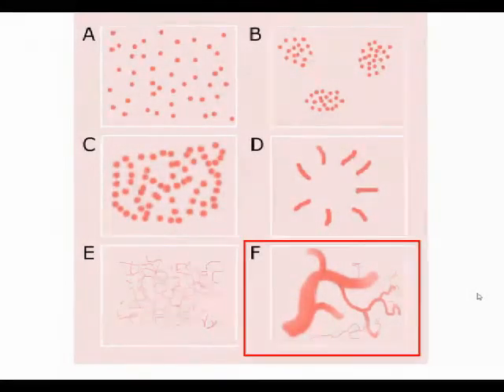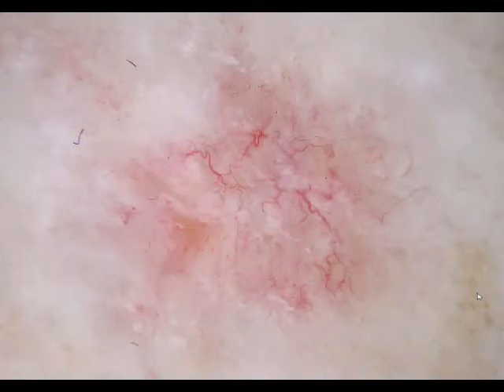This arrangement is very common. It occurs with serpentine vessels, and we call it branched arrangement, which means that from a thick serpentine vessel there are many thinner serpentine vessels branching off. This is an example. Clinically, dermatoscopically, you can see linear serpentine vessels in a branched arrangement. So branched serpentine vessels. In the metaphoric language, they're called arborizing or tree-like vessels.